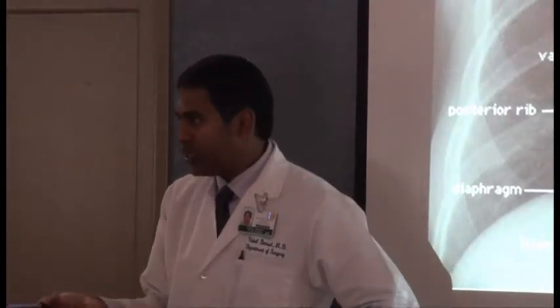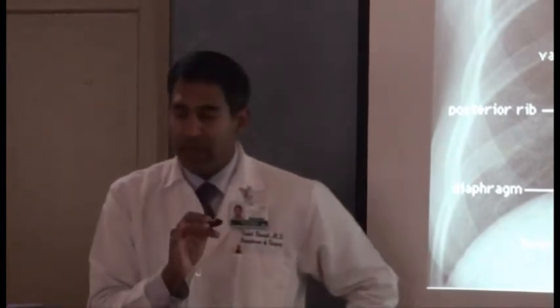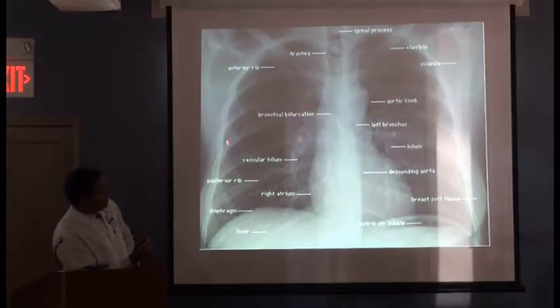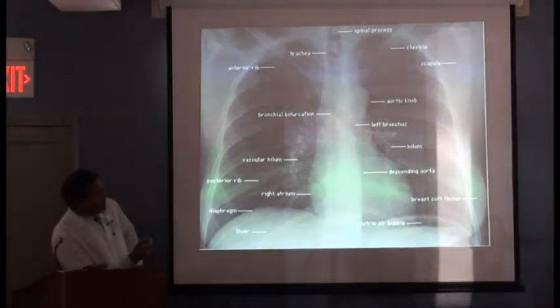C is circulation, all right? So we look at the circulation. Oh, also B, beyond the bone, is also the breathing. That's the way I remember to look at the lungs. So when we look at the lungs here, here's our lung fields. And do you guys see this kind of haziness? It's not totally dark, right? It's not black. It's haziness.